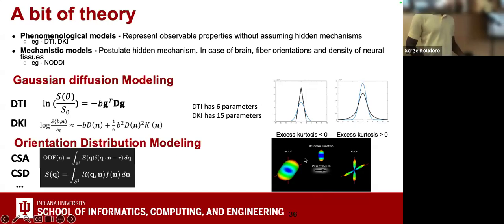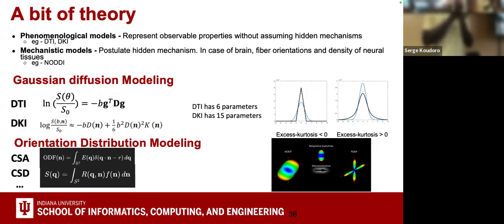And when you convolve a response function, what is this response function? It's just that we look at the fractional anisotropy, the FA, and we look at what is very anisotropic, where we are sure that we have only one direction. We are certain. So we take only 1,000 voxels, and we know that the water goes in this direction, and we are sure. So now that we know it is going in this direction, we model it.